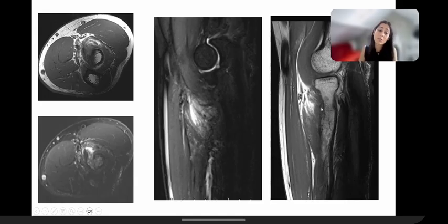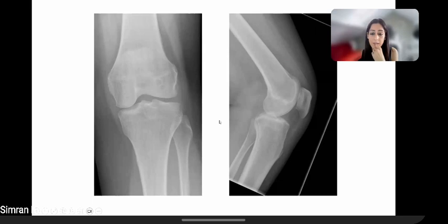So this was a case of bicipitoradial bursitis, secondarily resulting in this chronic pressure effect on the anterior cortex at the level of the radial tuberosity, causing it to form bone. So not all bone lesions, not all periosteal reactions are due to a primary bone pathology. It can be a pressure effect from the outside.